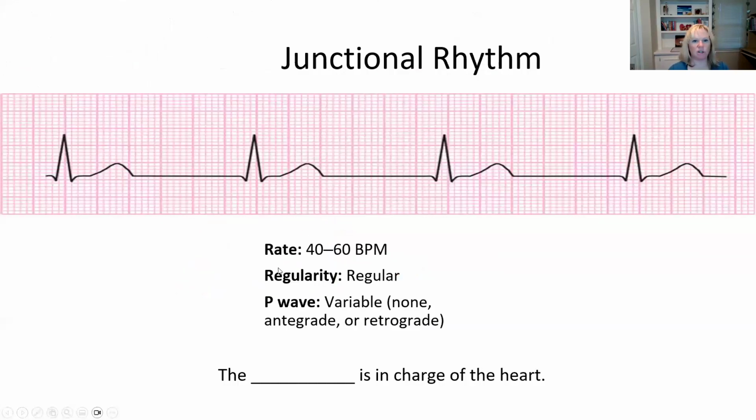All right, let's talk about the junction. So what is missing here? There's something very, yes, the P wave.